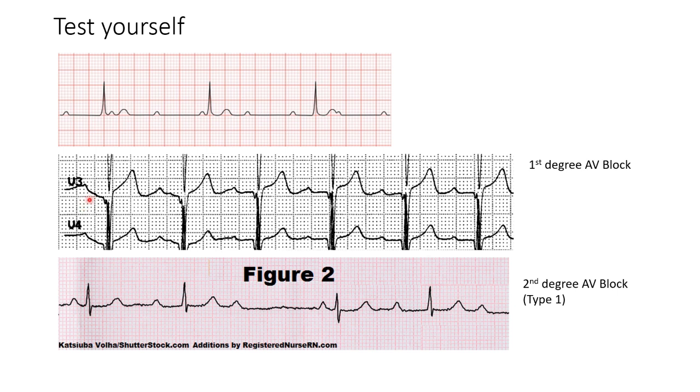Now, is there one before every QRS complex? It looks like there is PQRS, PQRS, PQRS, PQRS, PQRS. Be sure to check the entire strip so that you're not missing something, because in ECGs like this, it's easy to miss it because everything just looks like it's all smushed together.